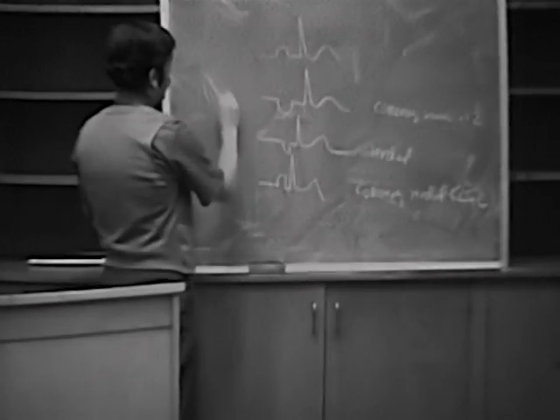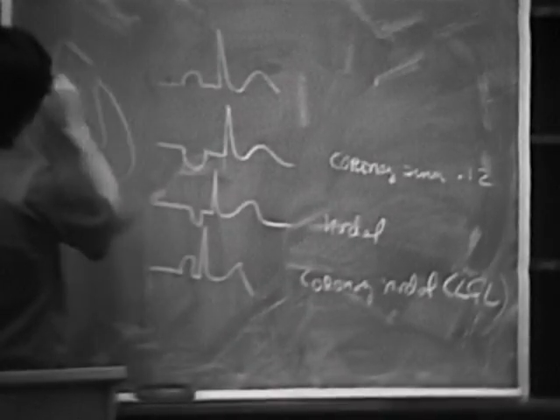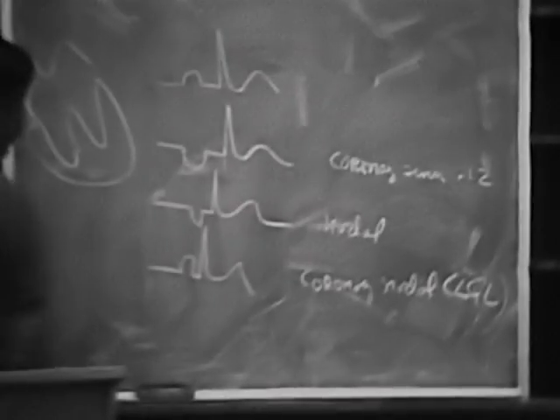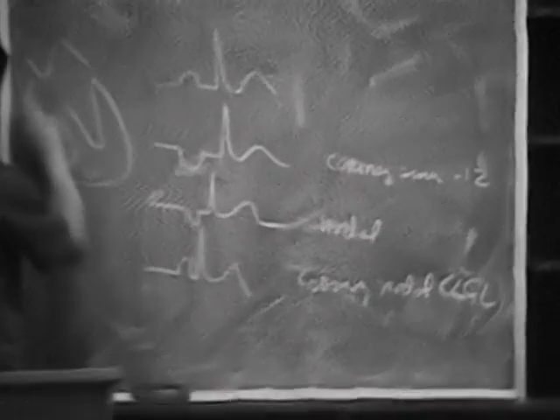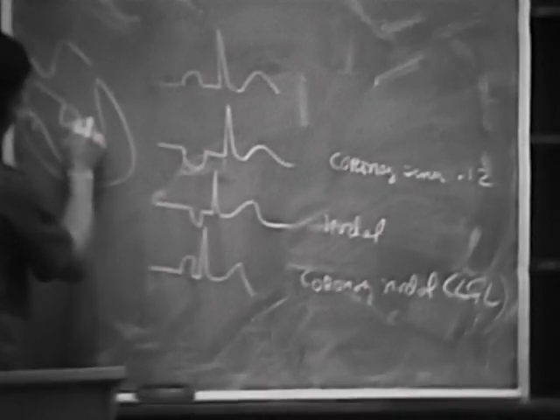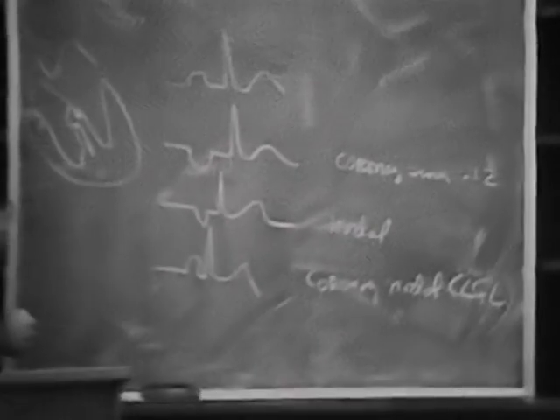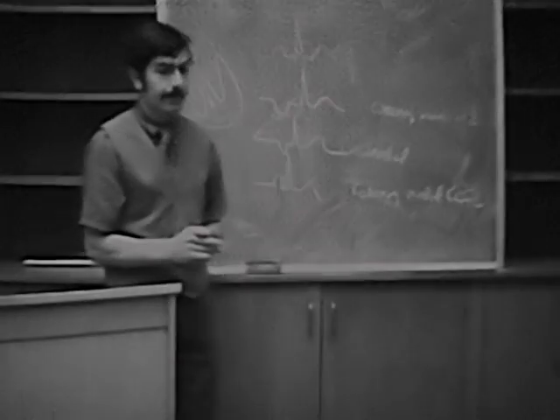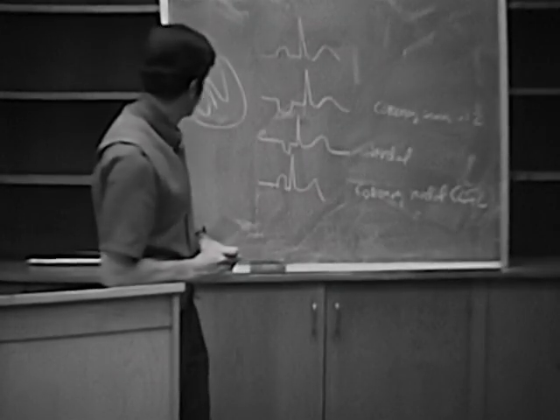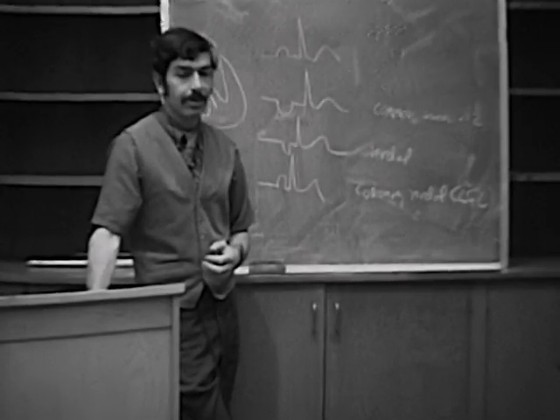And what's happening here, as you said, it's very much like the Wolff-Parkinson-White. In the Wolff-Parkinson-White, you have an accessory pathway coming around, right? But it's thought that with the LGL, you're bypassing the node. You're bypassing the usual delay at the AV node and coming right down. It's another bypass pathway. Okay, and again, these patients also have episodes of PAT, very much like those with WPW.